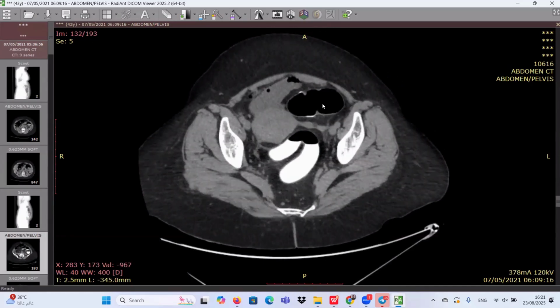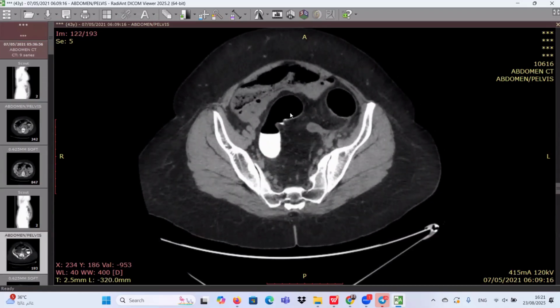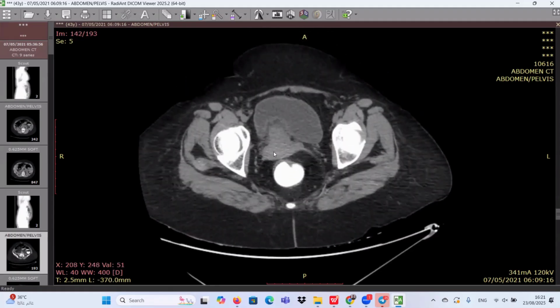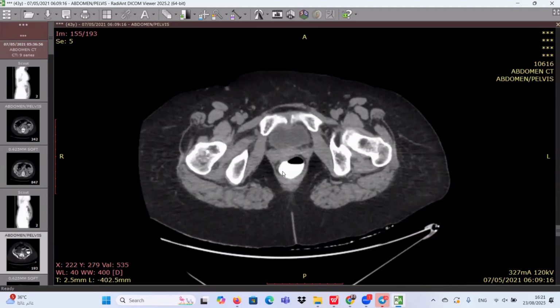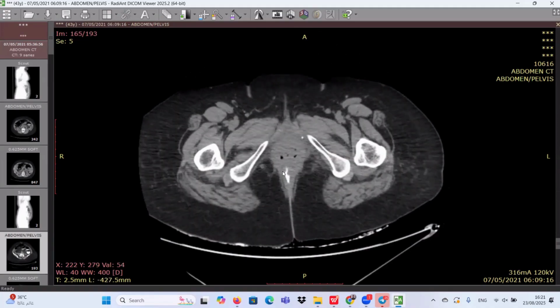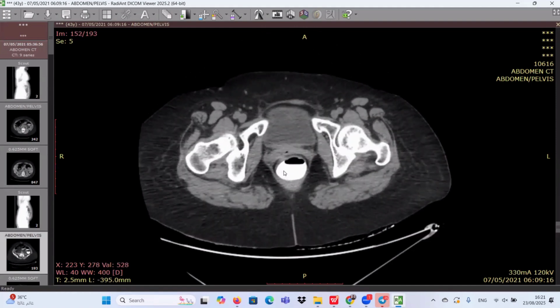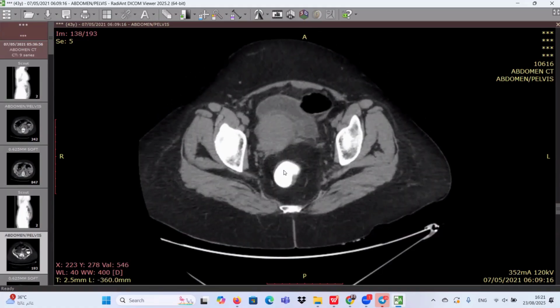I think nothing. We don't have the obstructing lesion. We don't have the transitional point. Is that correct? Yes, sir. It's really gone after doing this exam. The patient was much improved. The obstruction is totally improved because we did the CT diagnostic and therapeutic really at the same time.